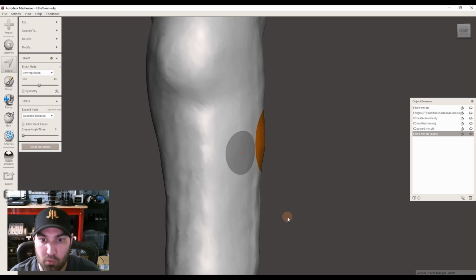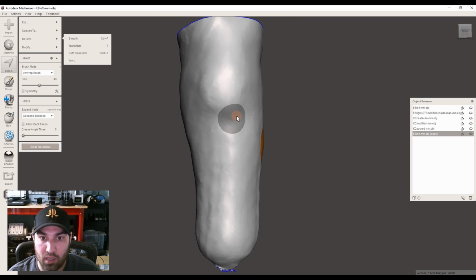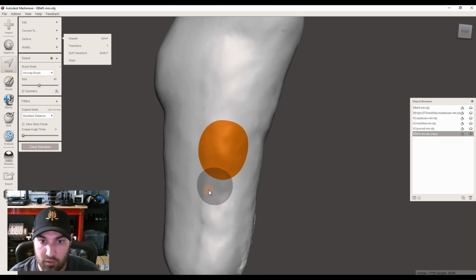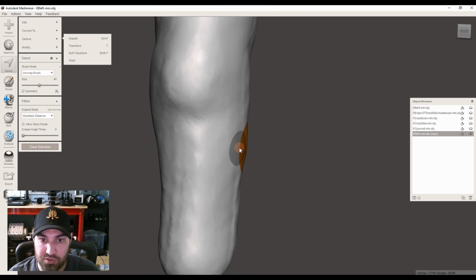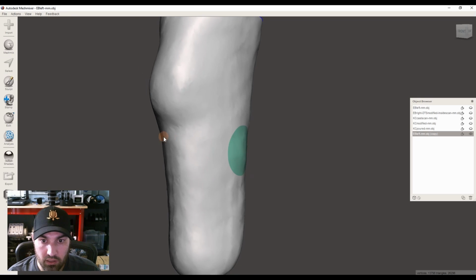Spacebar, flip back over to work on it here. So you can work on it in either one. I just find it visually a little more appealing to work without the other stuff after I've used it to select what I want. So first thing, hit escape.